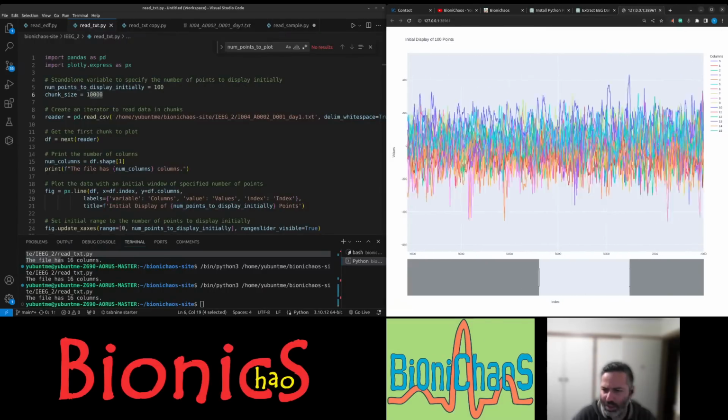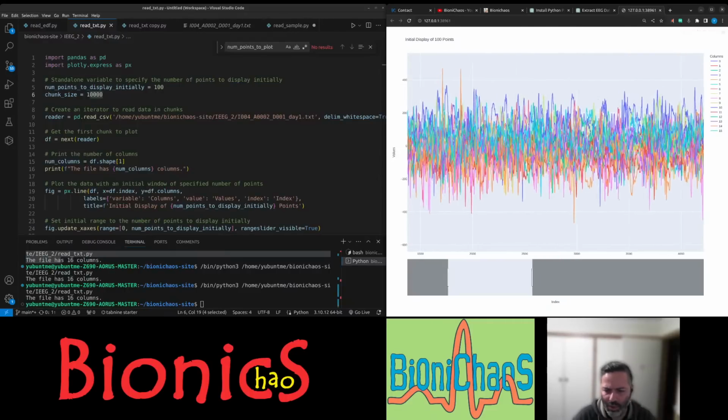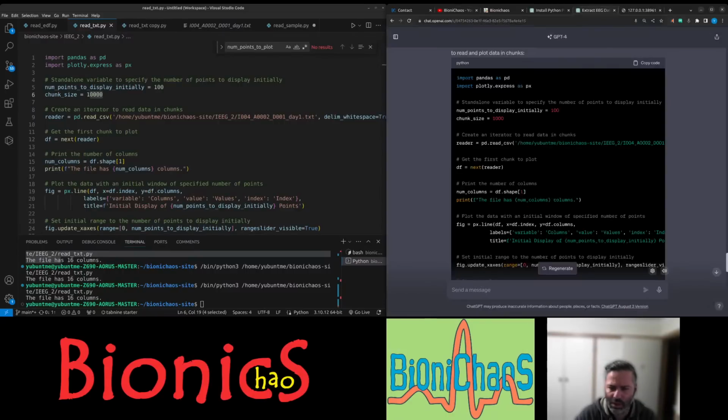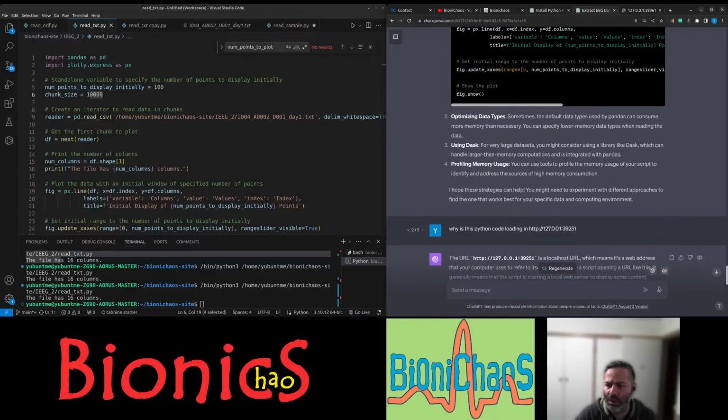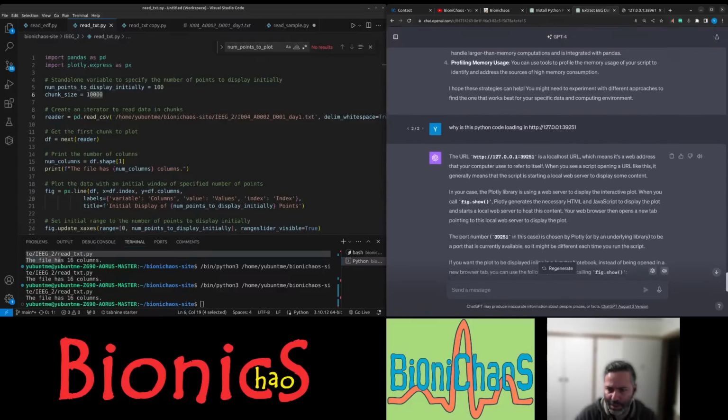There's just something not right about it. No, I mean, it probably is correct, but I still need to double check. The other good thing is this file is loading in the browser, so that's good. GPT-4 made it for us.